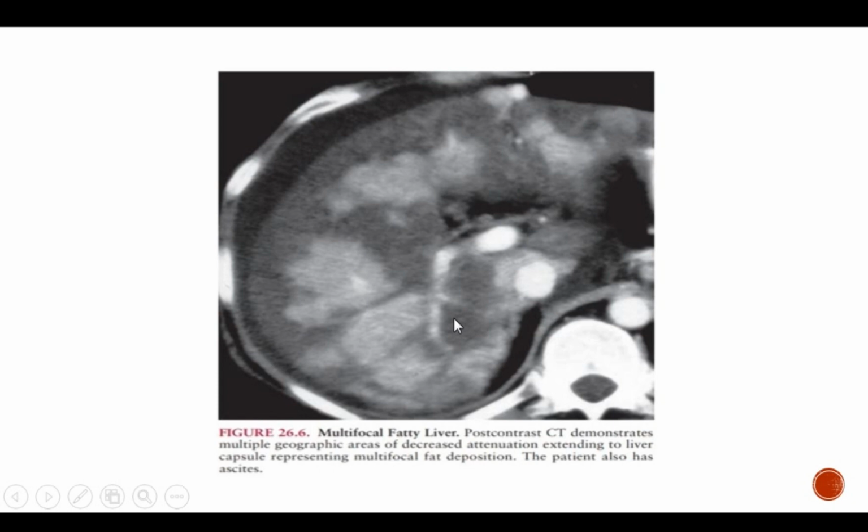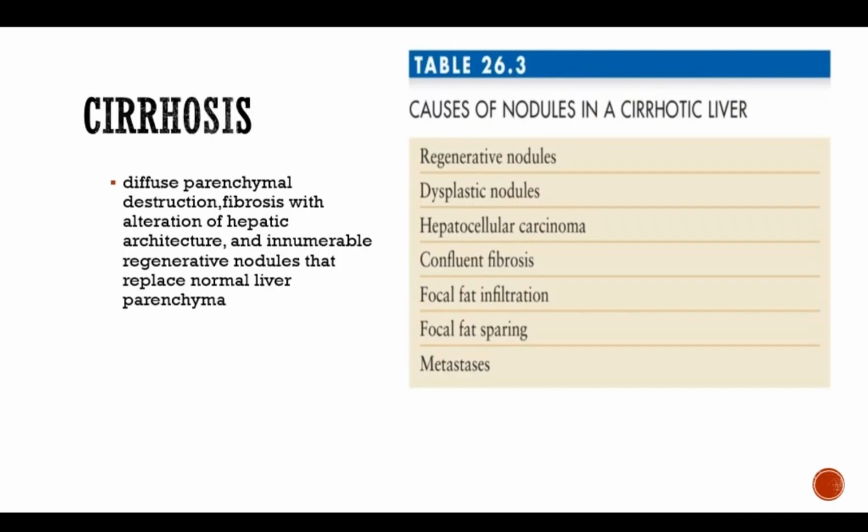Cases like that are really difficult to diagnose. By ultrasound, they look like multiple masses. By CT scan, they look like multiple masses. You do a biopsy and it comes back with nothing, just liver. It's annoying. So how do we diagnose it? By imaging. Do an MRI, with fat saturation or in-phase and out-of-phase imaging, and then you will have your liver without fat and everything will be okay. Their appearance overlaps that of metastasis.